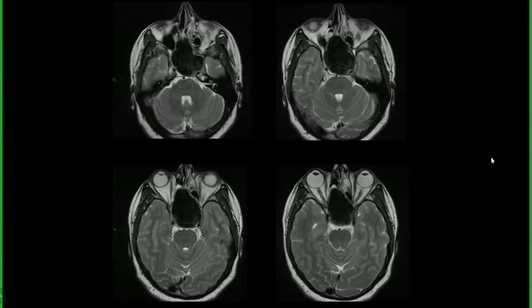Yes, sir. Okay. And what about hemorrhage? Can it appear dark? Yes, sir. Yeah. So which stage of hemorrhage will appear dark? Chronic can appear dark, sir. Okay. Then any other stage of bleed will appear dark? Only chronic will appear dark?